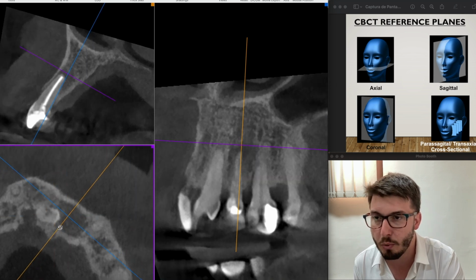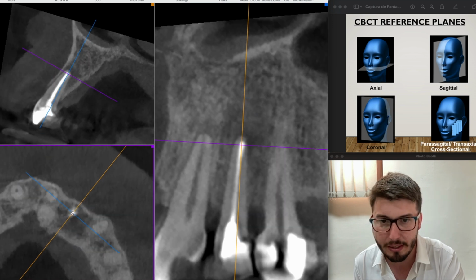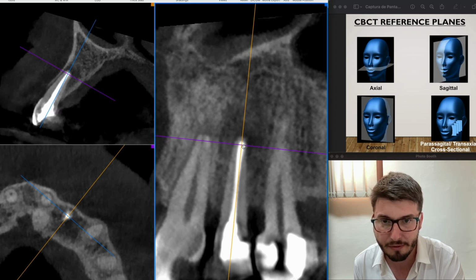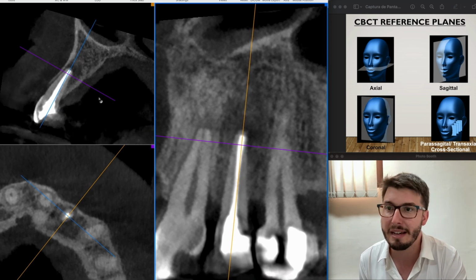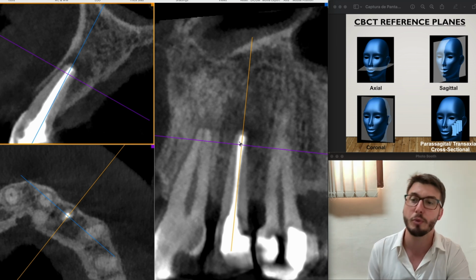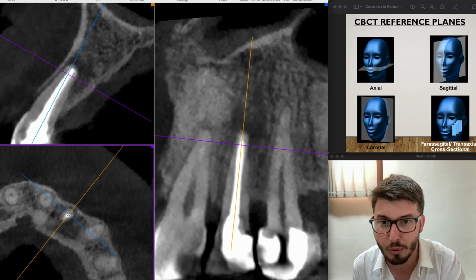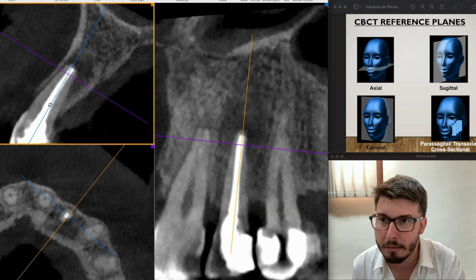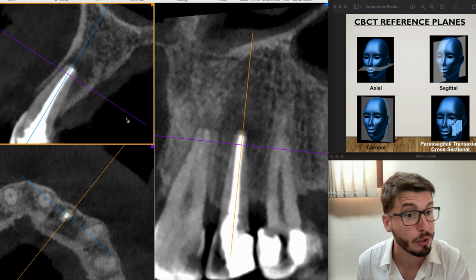Let's understand now what is going on with this lesion, right? So that's the lesion. The root is actually treated, so we have root canal treatment here. All right, of course there are artifacts, the metal artifacts, which would prevent us from diagnosing maybe even a possible fracture here. But okay, so we have this situation here. Okay, I enhanced the contrast, not only the brightness, the contrast as well, for us to diagnose better this situation. And you guys could also consider a chronic situation, so a periapical granuloma, but the limits are ill-defined enough for us to suspect acute alterations of the bone.